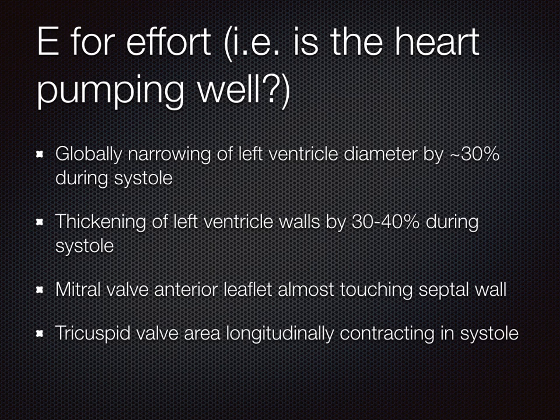Now, with regards to evaluating for right heart function, in certain cases such as right coronary artery occlusion, which affect the inferior and possibly the right ventricular walls, there may be a problem with right ventricular function. Now, this is probably a bit too advanced for your stage, but simple things such as on views such as the subcostal four chamber and the apical four chamber, we know that there is a longitudinal contraction, i.e. where the tricuspid valve is going to be contracted towards the apex during systole.